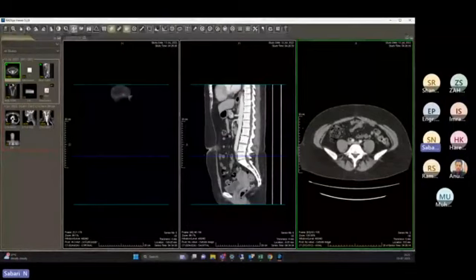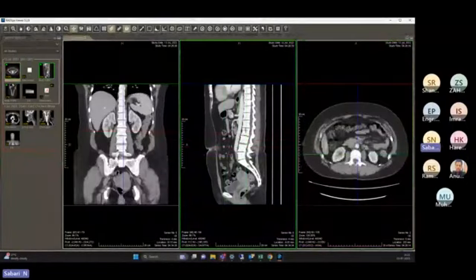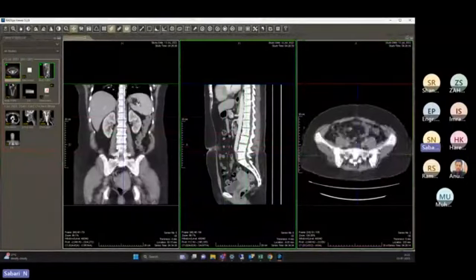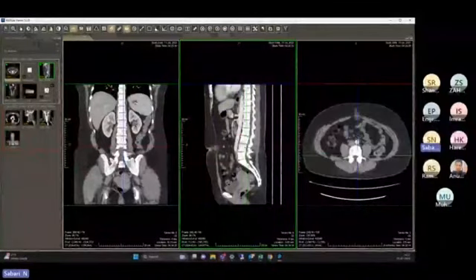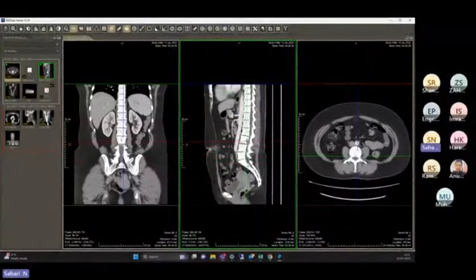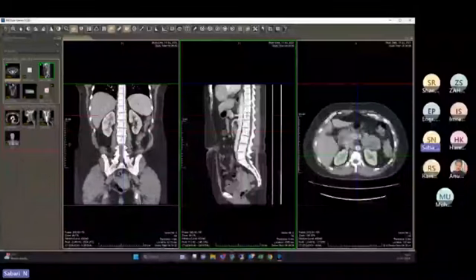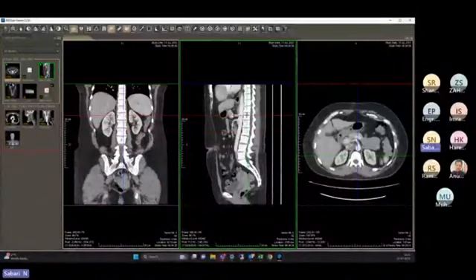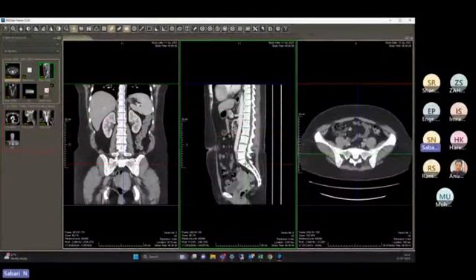So when I click on the 3D cursor, if I move to a portion of the body part, like S1, S2 or L1, L2 in the sagittal series, at the same time it shows both in the different views, exactly which body position I am currently seeing in the sagittal, coronal and axial.